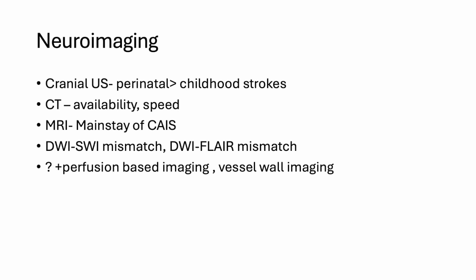There's also a phenomenon of a DWI and SWI mismatch, which is more popularized in the pediatric world, as it's an efficient way or an incidental way of effectively demonstrating a penumbra in the absence of perfusion imaging.